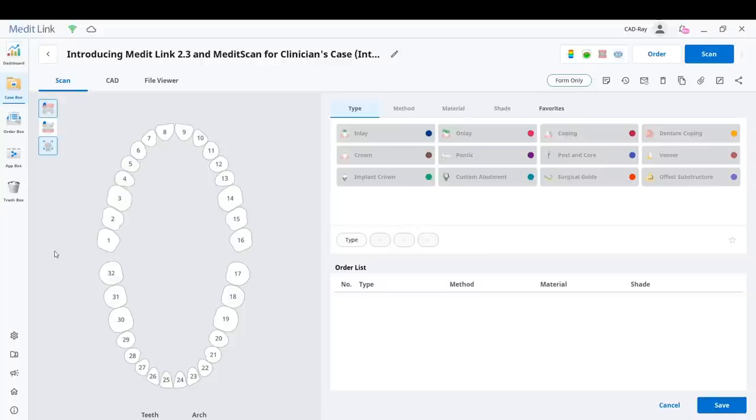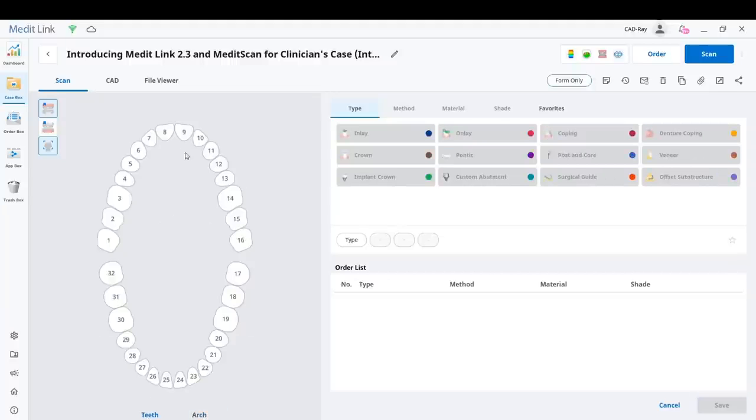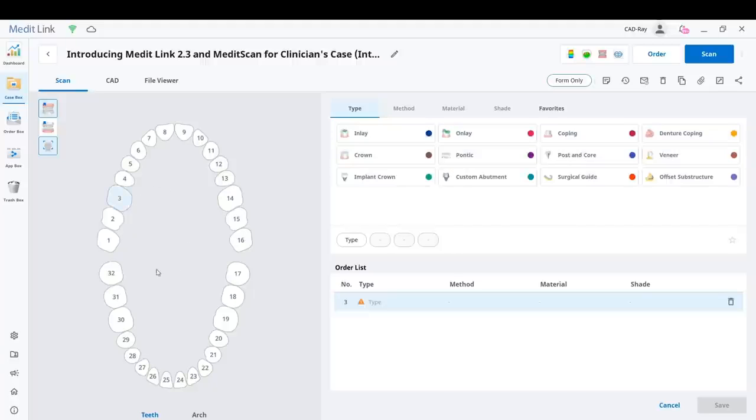In the face scan, you can bring in a bunch of different models into the equation and merge 3D scans, any STL file you want, basically, to models that you've scanned. Then we've got the teeth and the odontogram that you can toggle between the tooth form and arch form, and then you select the tooth number. Here we have the US numbering system. You could easily change it to the international numbering system if you want. And we can click on the upper right molar.